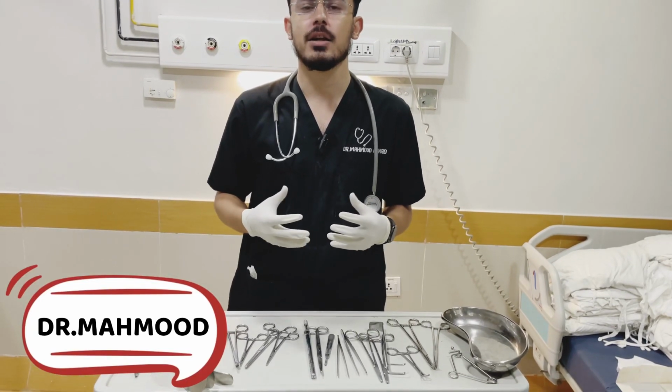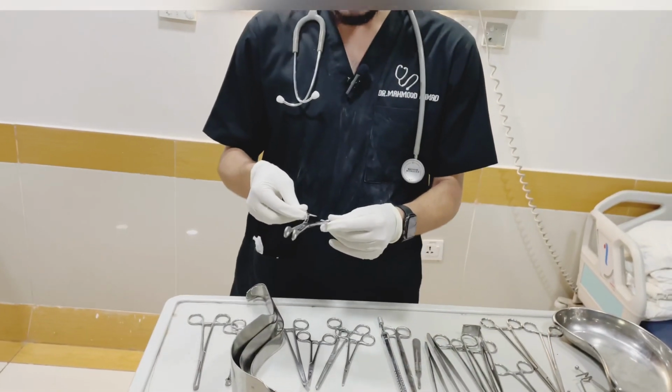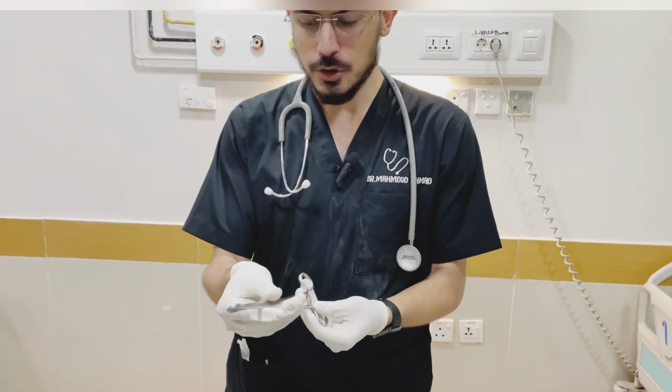Today we will be discussing the laparotomy instruments. So over to the instruments. This instrument is known as the sponge holder. Usually it is used to hold the sponge. So this is known as the sponge holder.